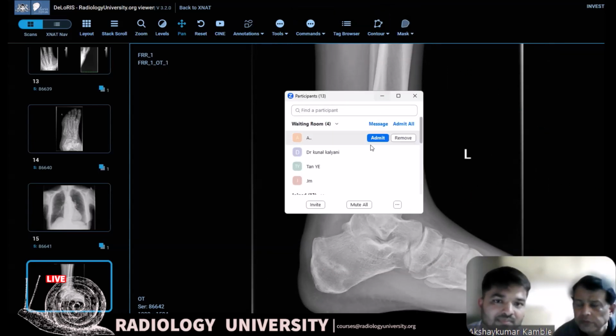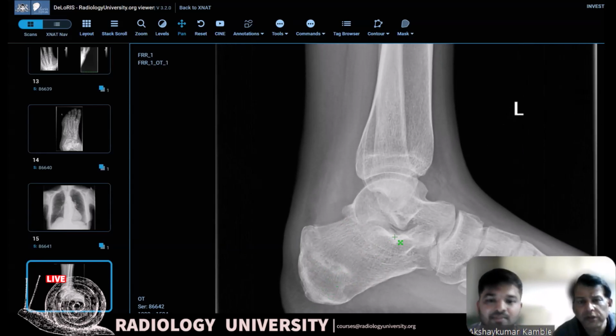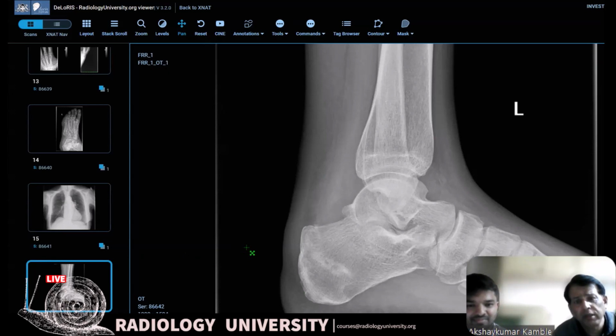Frontal lateral radiograph of the left foot shows a stress fracture in the left calcaneum. There is sclerosis. Correct. Very correct, very good. Actually, this is a very subtle one, but I really appreciate that you guys picked it up as abnormal. In the exam, you'll get a proper, factual one. It's a webinar version.